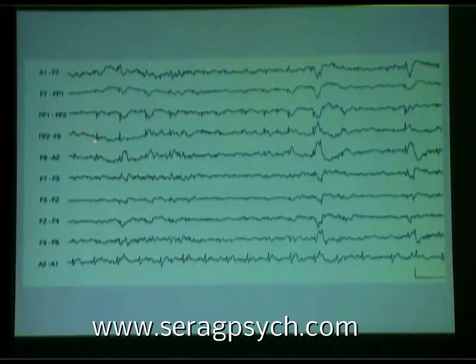These are not temporal spikes. This is very sharply reversing phase right at FP2, right frontal polar there. A temporal spike would be down and then further down and then maybe canceling between F8 and A2. A2, the right ear, often picks up very similar potentials to the right mandibular notch electrode.